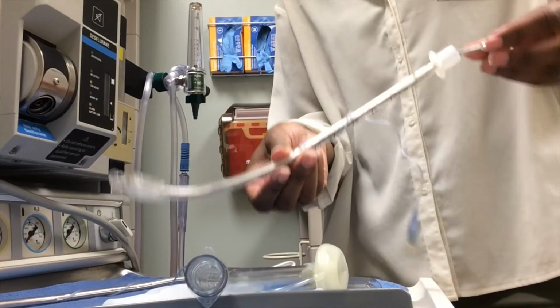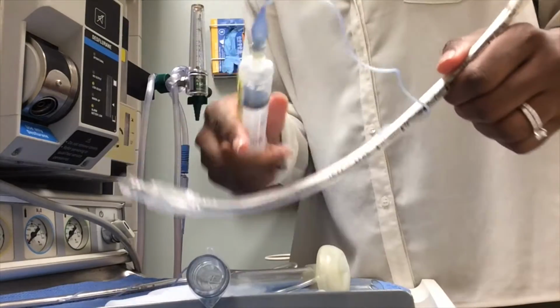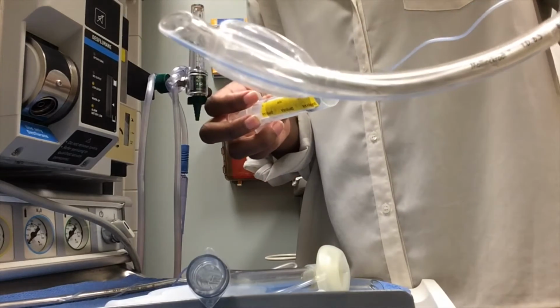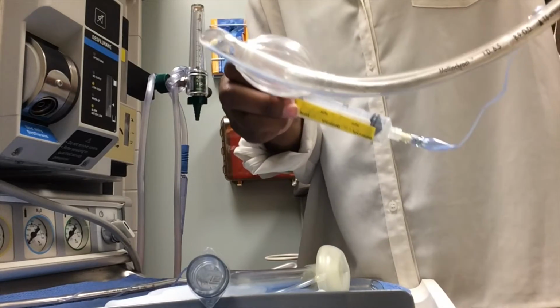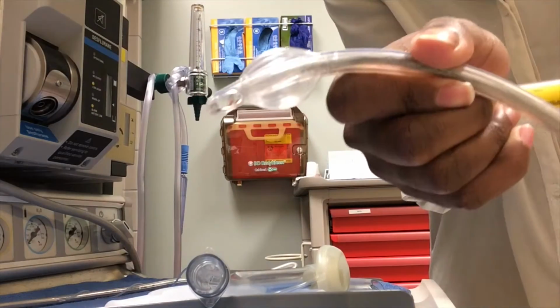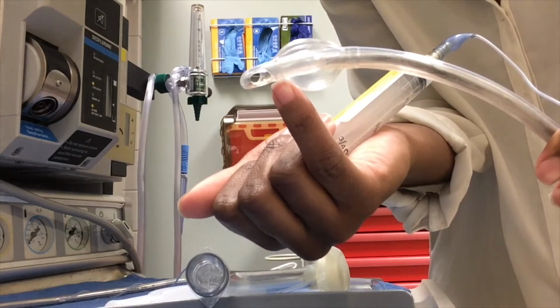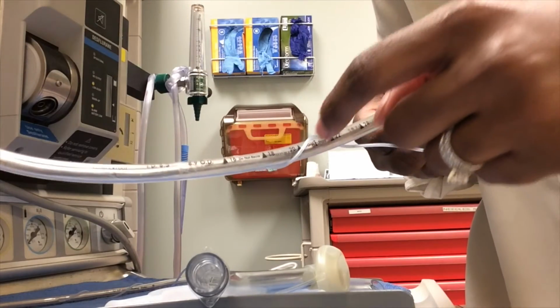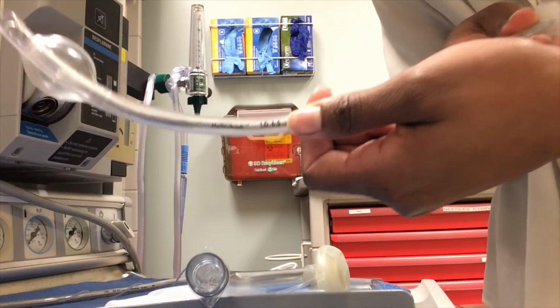It's one of the most protective types of airways because of this little balloon here. This balloon protects your airway by preventing gastric contents from going up. I'll put a little bit of air in it, and this balloon inflates right there. Now it can cause damage, but you like the protection from this. Another attribute of it is what's called Murphy's eye. So if this were to be stuck against tissue, you still have another opening where air can be given directly into your airway. When someone says 20 at the lip, 22 at the lip, that is what they're talking about here. And you get an internal diameter. This is a 6.5 tube.